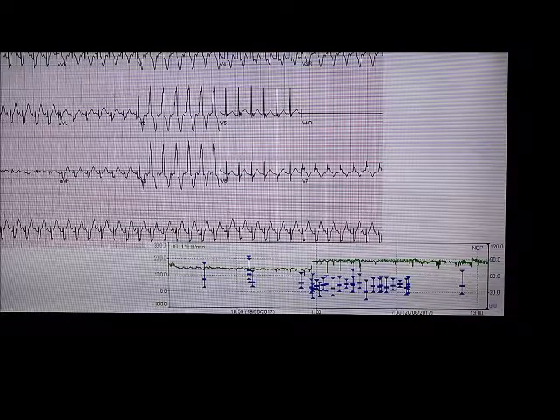Yeah, so usually positive in 1, 2, and 3 and aVF, negative in aVR, and usually equivocal or isoelectric in aVL. Okay? So this actually looks like that. One, positive, positive, positive, negative in aVR. It's positive in aVL, so that's abnormal a little bit, while aVF is positive. So this is very similar to sinus.